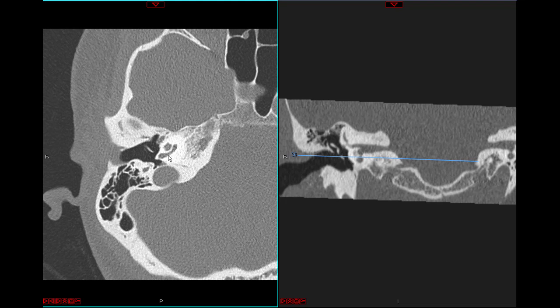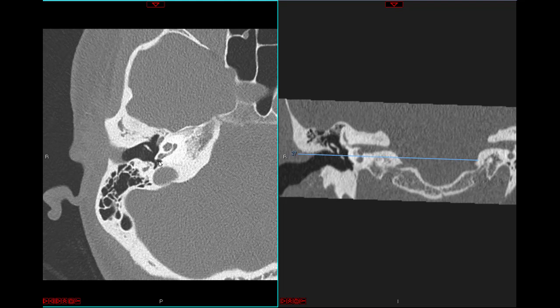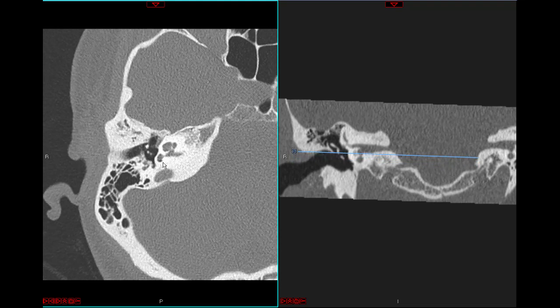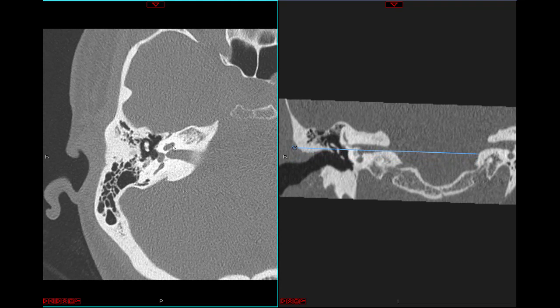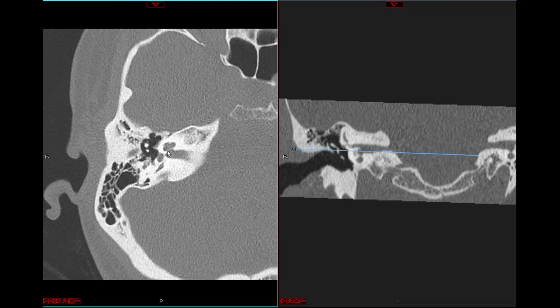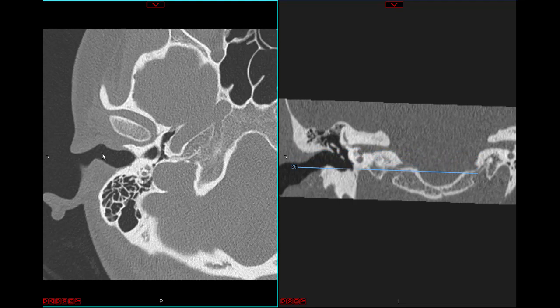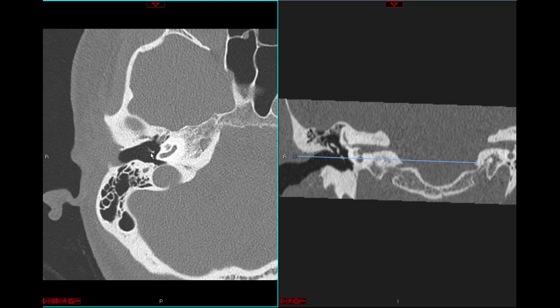Now, in the same light, you have this tiny little secondary, what we call a secondary tympanic membrane here, and this is the round window. So every time the oval window pushes in, the round window has to push out for there to be proper pressure differences to appreciate sound. So that's what a sound wave is going to do. Again, coming in the EAC, vibrate the tympanic membrane.